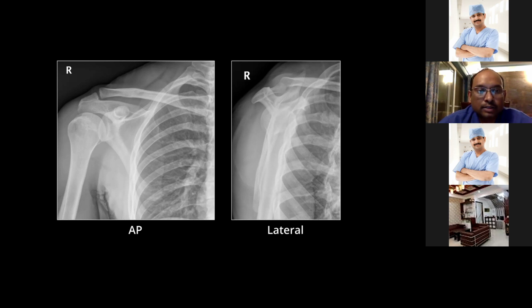If there is a reduction in the acromiohumeral space, and along with that, you will see some irregularity in the cortical margin, some irregular areas of sclerosis and subcortical cysts or lucencies. These are the signs of rotator cuff degeneration. Like when there is a complete rotator cuff tear, it has moved the humeral head above and it is impinging on the acromion. So that is an indirect and very good evidence of rotator cuff degeneration.